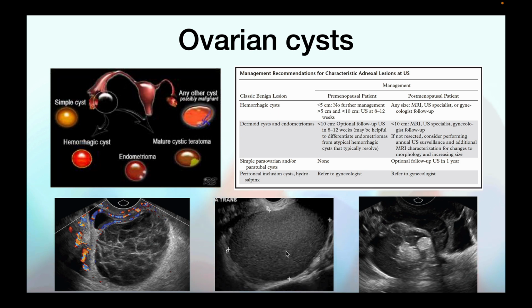Now, this is an endometrioma. This is associated with endometriosis, an ectopic endometrial tissue from the uterus that migrates its way up to the ovary, implants, and becomes a cyst. The characteristic feature is this ground glass appearance. Ground glass is thrown around a lot in medicine, but basically, it's just this homogeneous echo that you'll see. And endometriosis is a very common cause of chronic pelvic pain. Oftentimes, if you see an endometrioma and the patient has months-long, maybe years-long pelvic pain, that is probably the diagnosis.